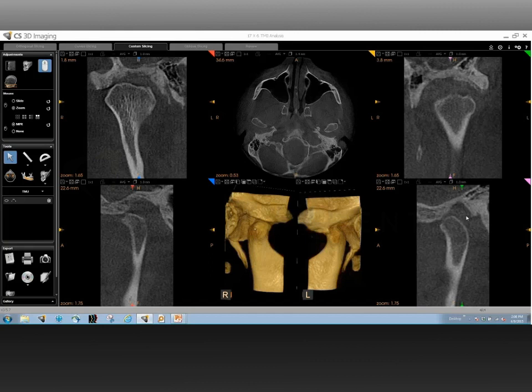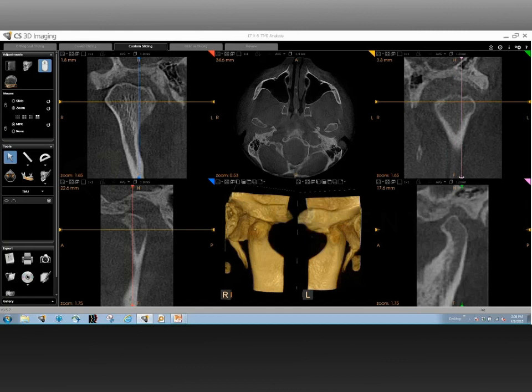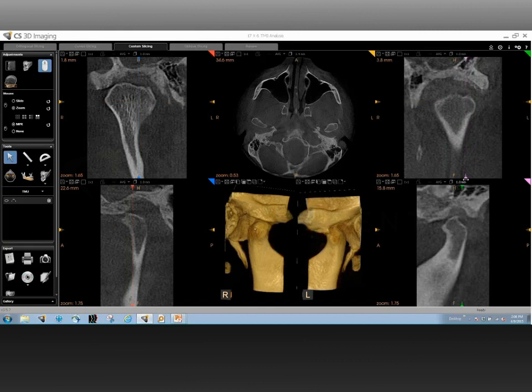We are able to now see the lateral view all the way from the lateral pole of the condyle to the medial pole of the condyle. And let's do the same thing in this case. Let's start from the lateral pole of the condyle, and let's travel all the way through. And we did notice some sort of an indentation, remember? I mentioned that. And Jordan, let us stop right there, and let's look at that indentation. See that indentation on the head of the condyle, and look at what we see right over here.